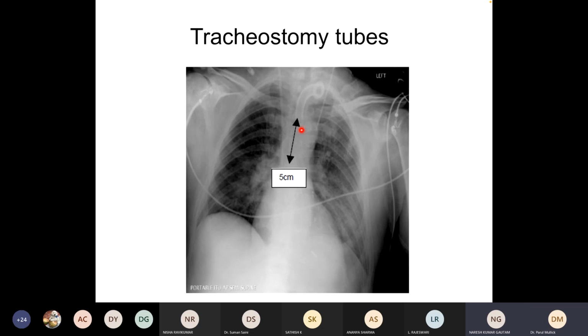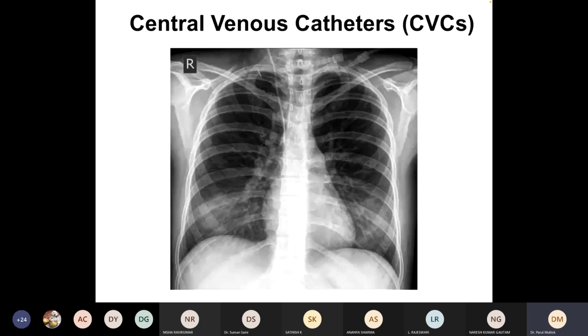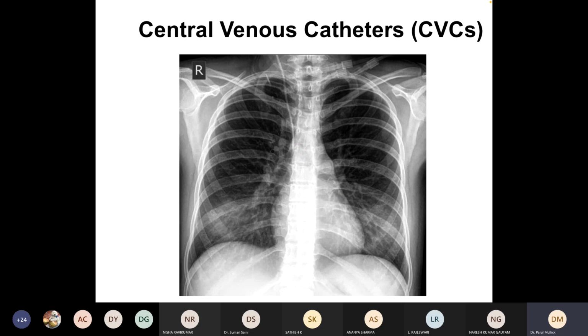अब ये क्या है यहाँ पे, सेंट्रल वेनस कैथेटर, ये दिख रही है? देखो ऐसा है, और यहाँ पर ये कैराइना दिख रहा है, ये देखो, ये ट्रेकिया है. कैराइना ढूंढने के लिए, अगर बाय चांस कभी तुम्हें कैराइना ना मिले, तो एक ब्रोंकस पे चलो, उसको ऊपर ऊपर चलो, जहां वो दूसरे को मिलेगा, ये रहा, ठीक है, या यहाँ से चलो, ये रहा, ऐसे भी ढूंढ सकते हैं.